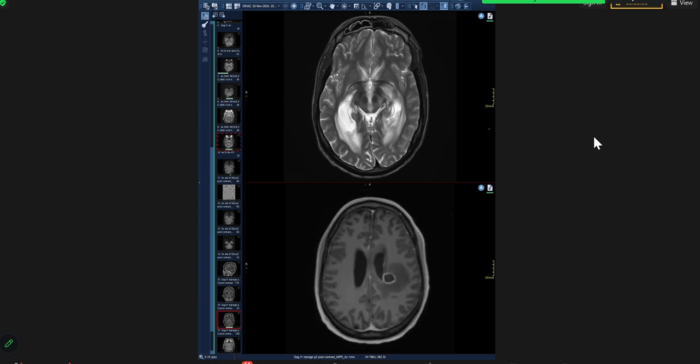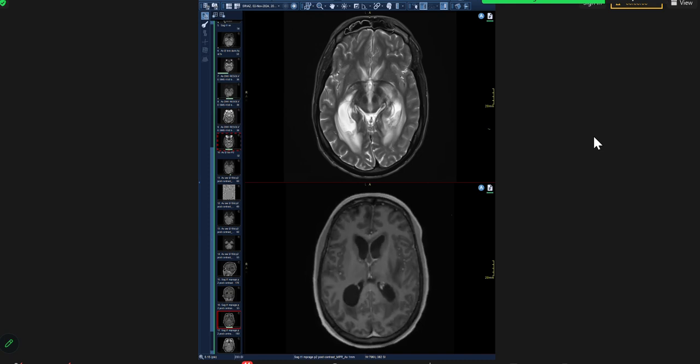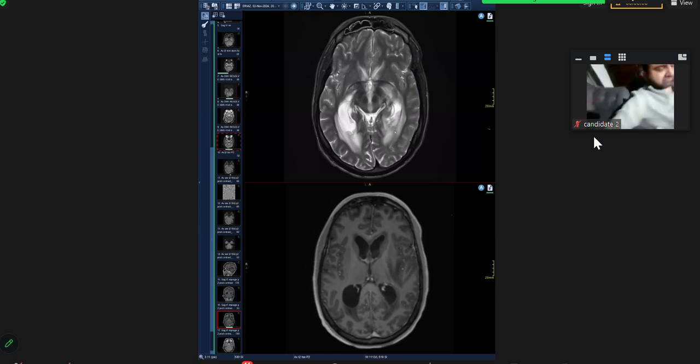Because the ventricles are dilated and they have this pus and all this edema, that is ventriculitis, I guess. So I don't know if there's a case on Radiopedia for that to see, or if you can see that yourself.